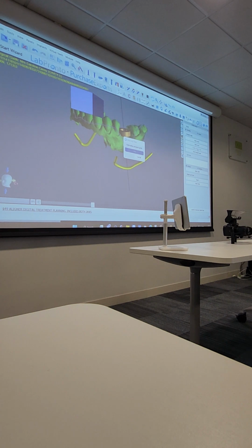And what you're going to see once it's done the surgical guide for you, again it's all color coded. You can change the colors to whatever you want. I'll be sticking to the same colors because then your brain knows exactly what color is what. Once it's done it, there you go.